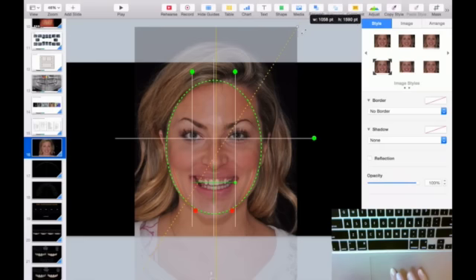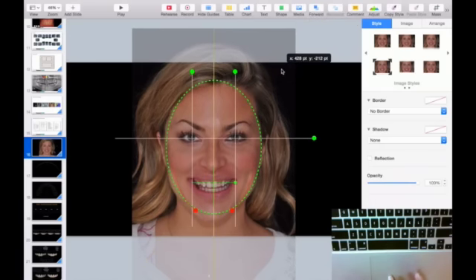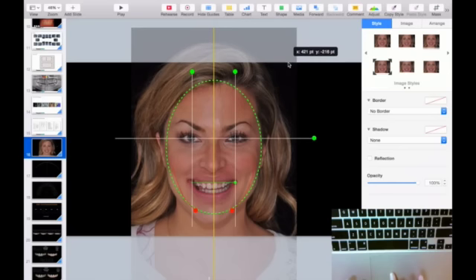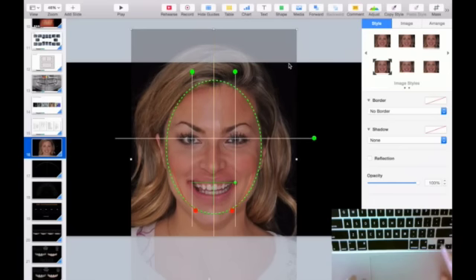So I would make it a bit bigger. First things we align are the horizontal lines. So the first one I'm gonna do is pupils, and see if they are pretty much aligned. I'm gonna make it a little bit bigger. Then commissural line.